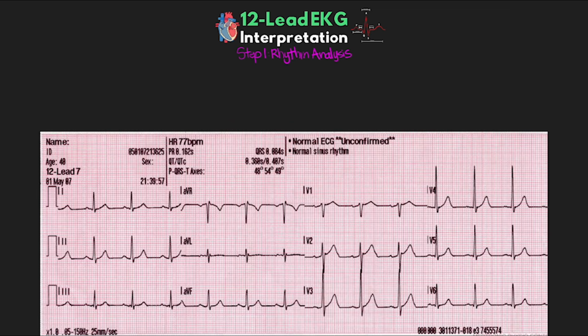Watch that lesson if you certainly aren't comfortable with that stuff. But when it comes to our rhythm analysis, first we want to actually determine the regularity. So we want to determine if the rhythm is regular, regularly irregular, or irregularly irregular.